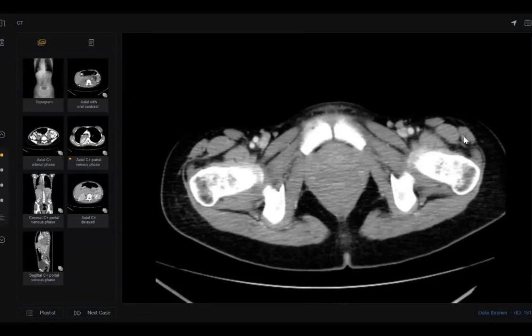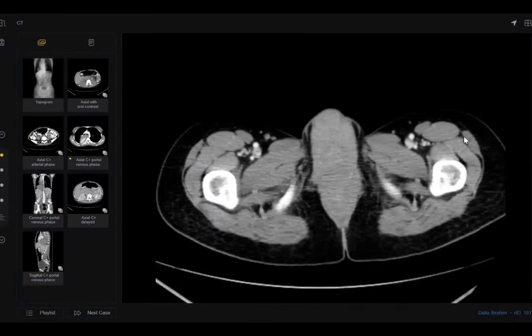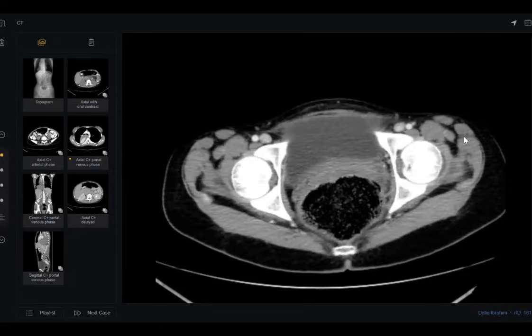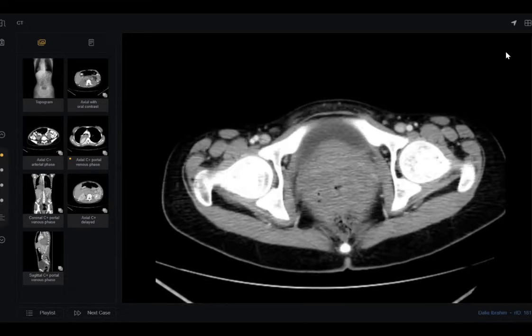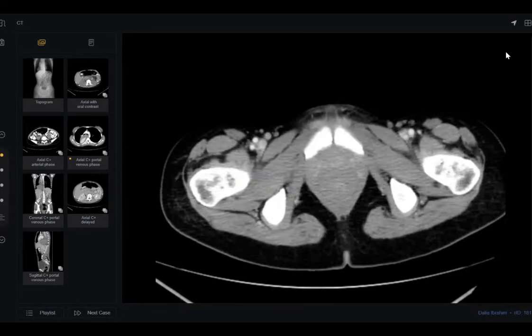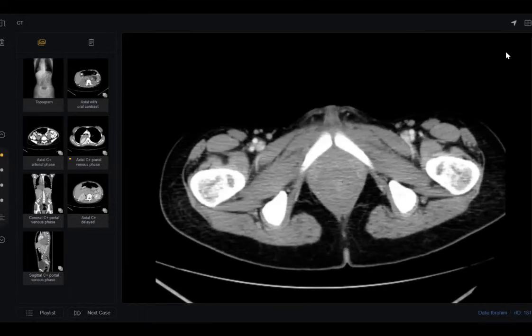The patient also has constipation. So we must have a look at the lower gut, if the patient also has constipation. Look, what happened here? So what do you think? It could be scleroderma, a possibility which is giving rise to a dilated esophagus and also the constipation.